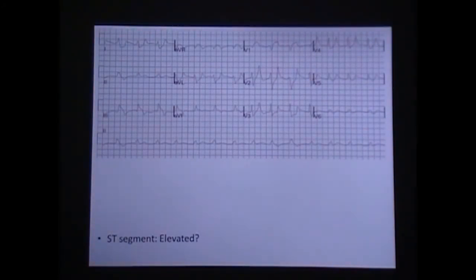And my V leads, like V1 it shows elevated, but it's discordant. I don't know. This is a hard one. That's why I gave it to the captain. It looks like to me it would be depression in V2, V3, V4 with big peaked T waves. All right. Where are you seeing the peaked T waves primarily?